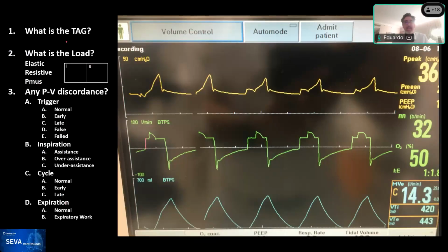All right, excellent. And just looking at the pressure waveform concurrently, we don't really see that nice square waveform that we would expect if it was a pressure breath. So I think everybody was kind of on board that this is a volume controlled breath. Now the next question that comes in, is this going to be IMV, CMV, or CSV?